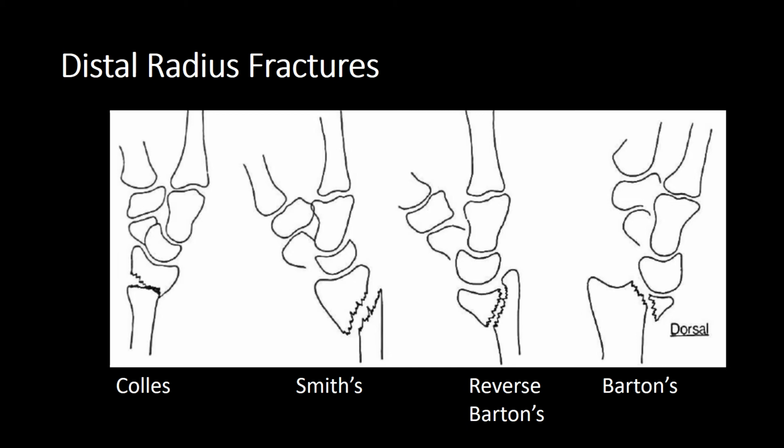So with a Colles fracture, you get a transverse fracture causing a real gape to the volar or anterior cortex of the distal radius. And then you get this dorsal deformity with comminution of tiny little bone fragments, creating this dinner fork deformity because you have dorsal angulation of the distal fragment.